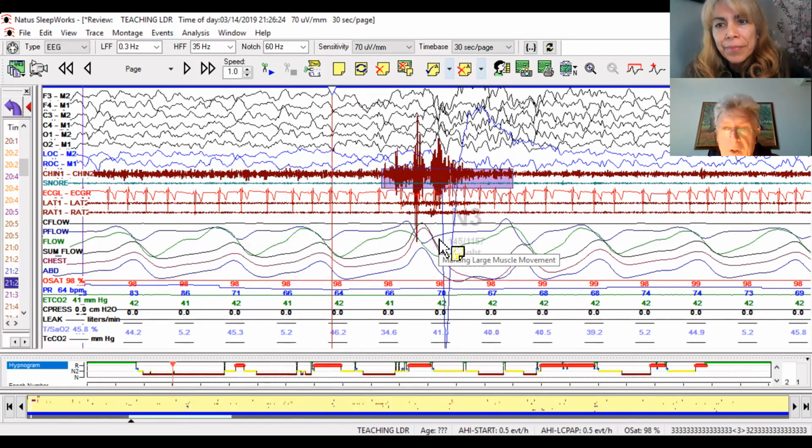And I want to focus the attention on the presence of a large movement artifact on one of the EOG channels in this case. That is a movement artifact. It is not a technical artifact. It's very large. It goes for the whole page, up and down. And it is something that has a meaning. It reinforces the idea that there has been a large movement there.